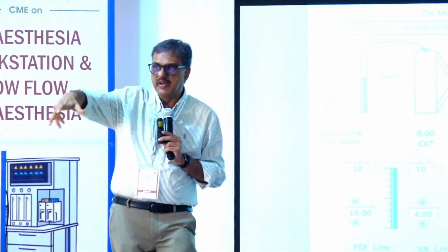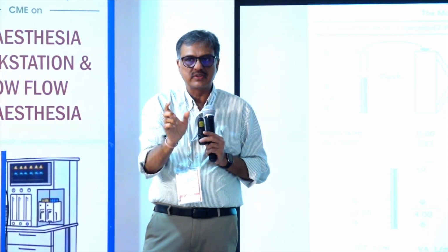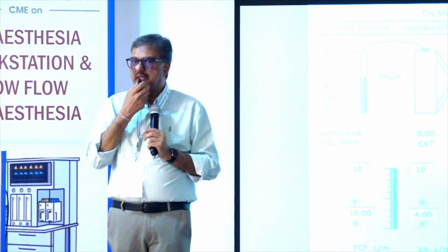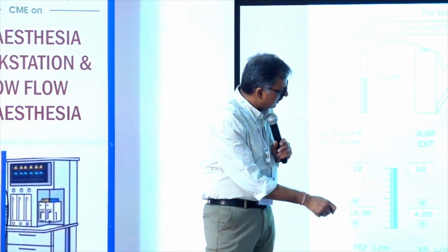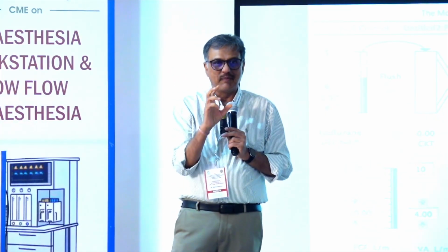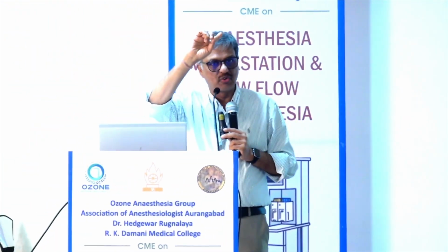What we delivered, and what the patient is taking. If you find out the difference, that is the wastage. So we can easily find the wastage from here, what wastage we are doing. And there is another tool through which you can toggle it, so from liters it changes to dollars or rupees. So you can find out what amount you have wasted. Clear? This part clear? Then we'll go to the next.